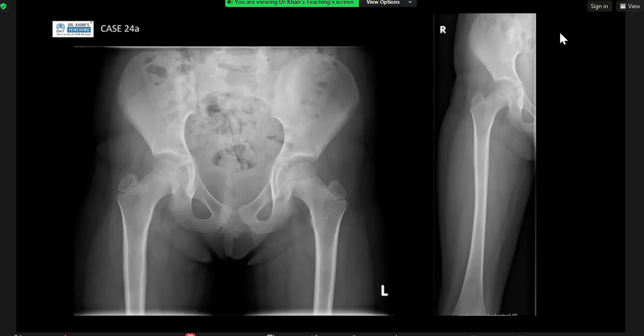This is a frontal radiograph of the pelvis with a single view of the right hip. I'm looking at the bones. There is an avulsion fracture of the left lesser trochanter of the femur. The rest of the bones appear normal. The soft tissues appear normal.